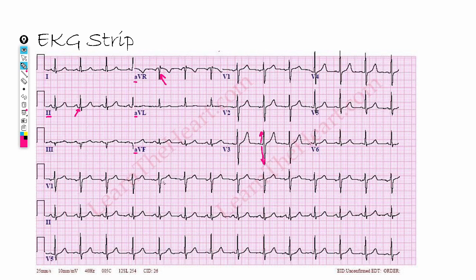Now, the thing is, all of these, here, here, here, here, they're all QRS complexes. They all show ventricle depolarization. But the real question is, why are they pointing up and down? What does that mean? I'll break it down. Next slide.